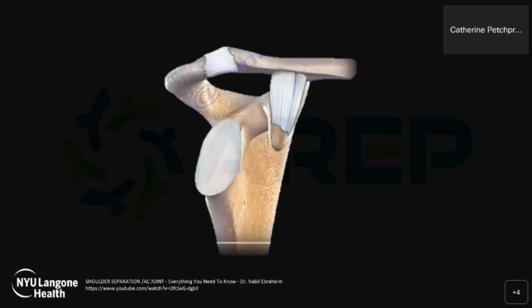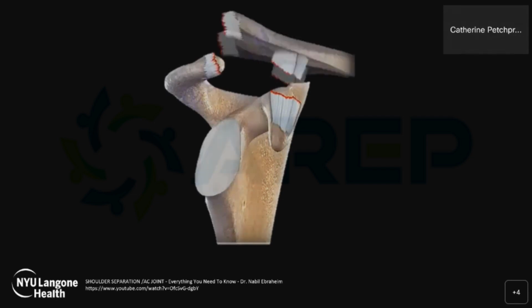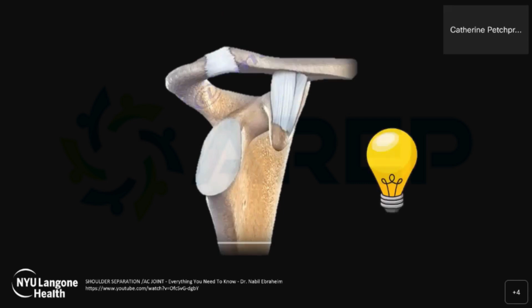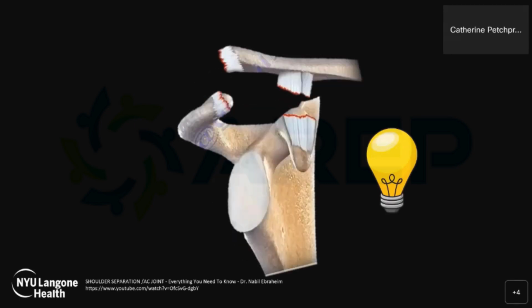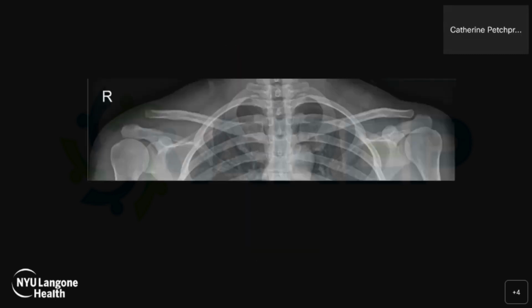On an interesting note, we're used to talking about elevation of the clavicle when we talk about acromioclavicular joint injuries. Droop down after it has lost its connection to the clavicle. This frontal radiograph of both AC joints shows it well. The clavicles are in line with each other. The right shoulder, however, is lower than the left because it is no longer suspended from the clavicle. This is a fun fact, but don't worry. For the rest of the discussion, we will continue to refer to the motion of the clavicle as elevation, as it has been historically described.